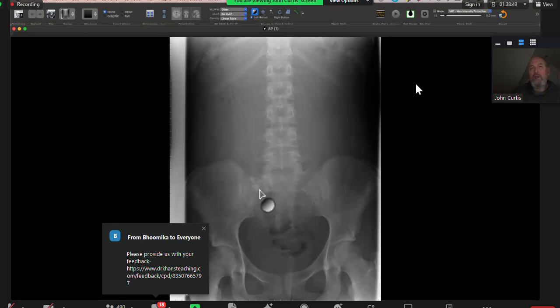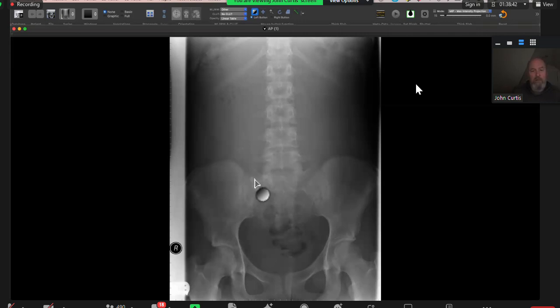Looking for it, I can't find it. These are teeth. Can you see any calcification anywhere else? There is no calcification anywhere else. Just there, maybe. Can you see that? Very faint. Yeah, this was a dermoid. Okay.